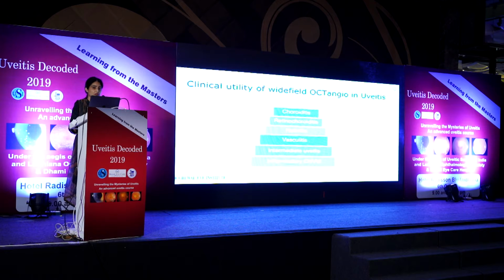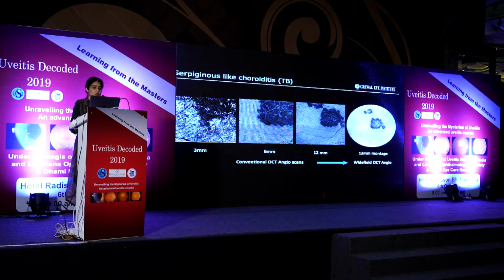In the next few minutes, I'll be taking you through various clinical scenarios to understand the utility of this fancy device. This is one classic example. Dr. Anirudh has beautifully shown the use of OCTA in serpiginous-like choroiditis.